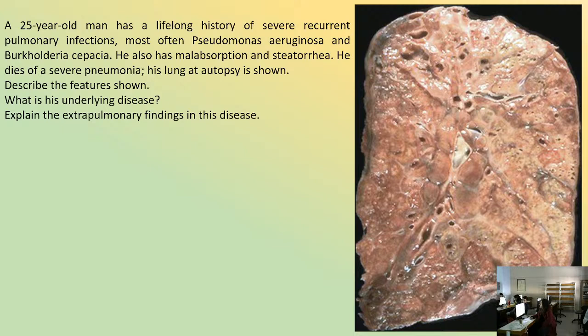However, in the present case, apart from this ectasia of the bronchi, we have pneumonia as well. This is why this large part of the lung appears consolidated. However, this is a mixed type. We have bronchiectasis and consolidation due to pneumonia.